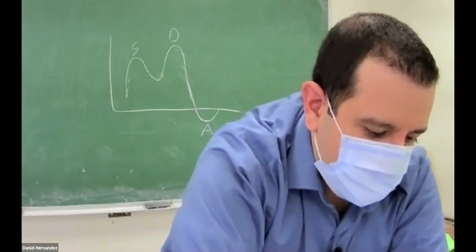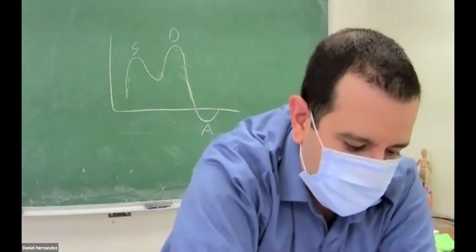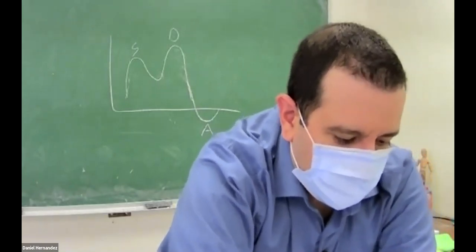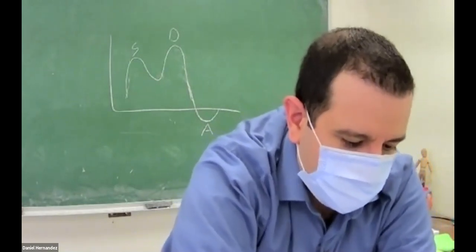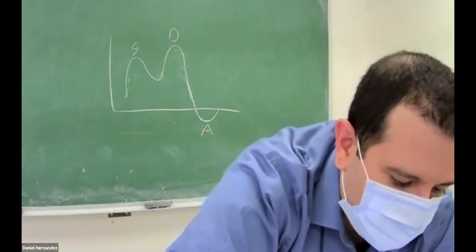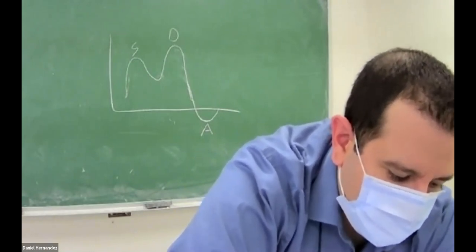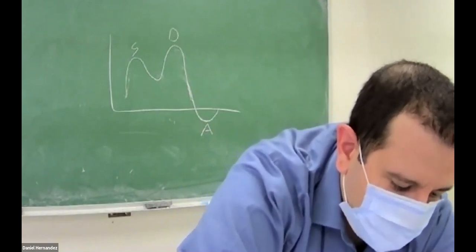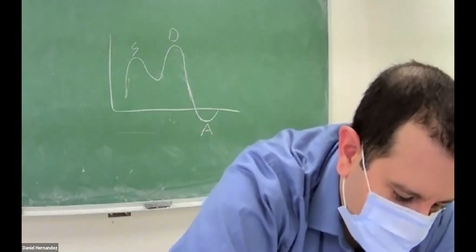A chronic contained ventricular rupture would be more describing a pseudoaneurysm. A hole between the two ventricles due to ischemia would also be a potential ventricular rupture. With aneurysms, the heart's not going to be hyperdynamic. And then thrombus would be thrombus.